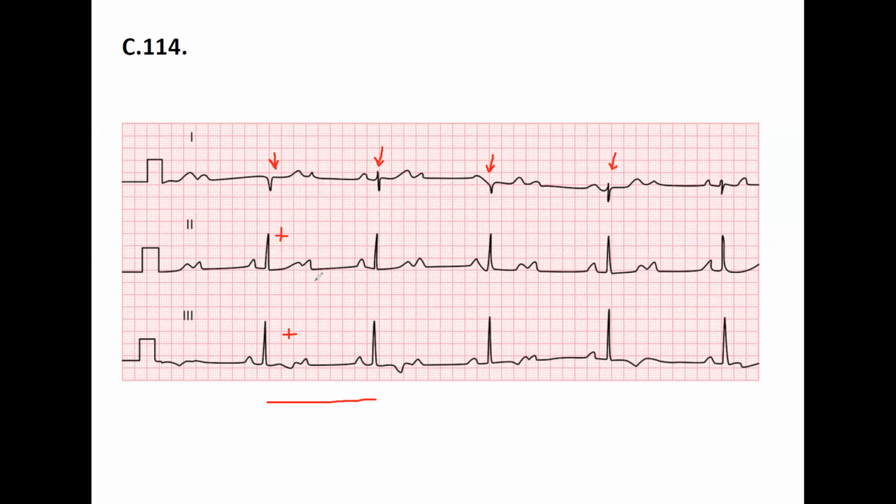All right. I was thinking about the P waves in lead 2 because they keep changing their shape. So maybe a multifocal atrial beat formation, but I'm not sure. And then there's no Q or S wave in the QRS complex. So I don't know if that's because the depolarization vector of the wave is going straight towards the electrode or if there is some other issue.